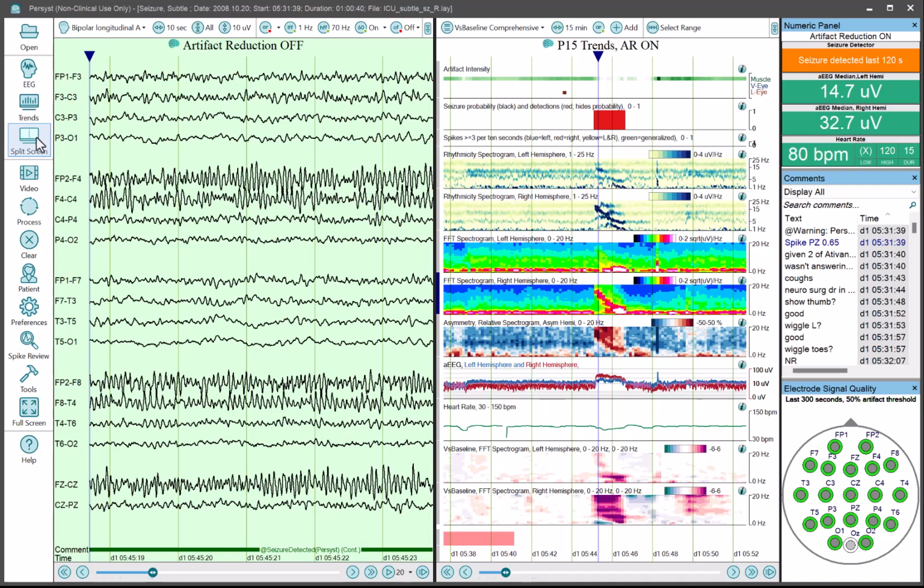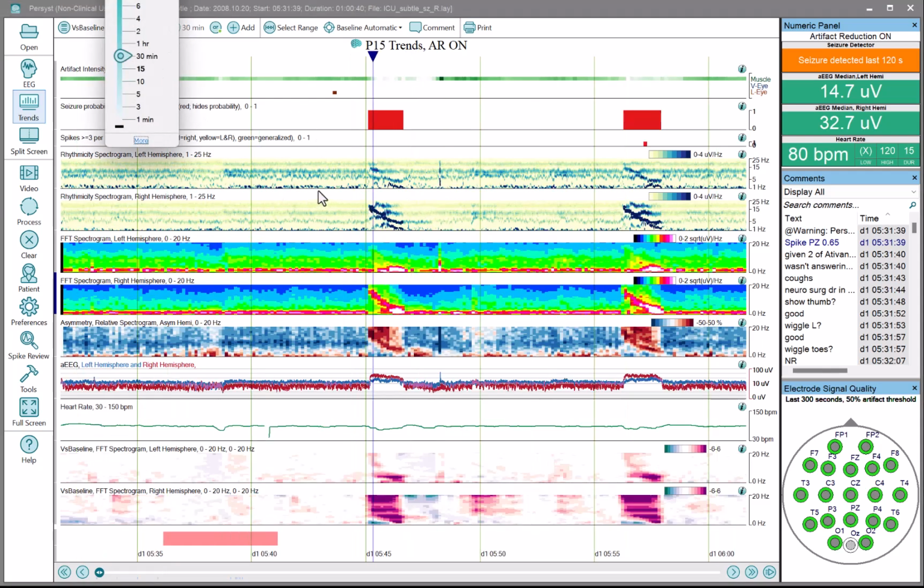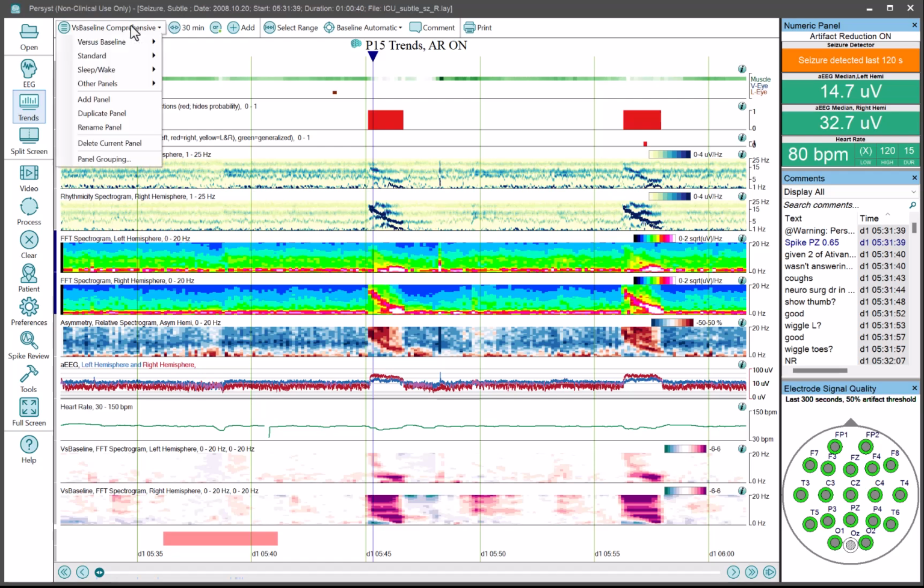So let's get started. I'm going to show just the trends, and I can do the entire trend or I can pick a range. Let's do 30 minutes. And if you want to do the entire range of trends, we'll just do export from the GUI. And again, with research, you can batch process and batch export CSV values and automate your pipeline and have a trend set up with just the trends you want to be exported to CSV. And those could be quite a few trends if you wish to do that. You're not limited to what's in the default setup. You can customize this extensively.